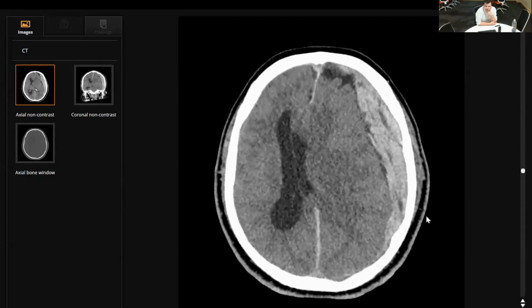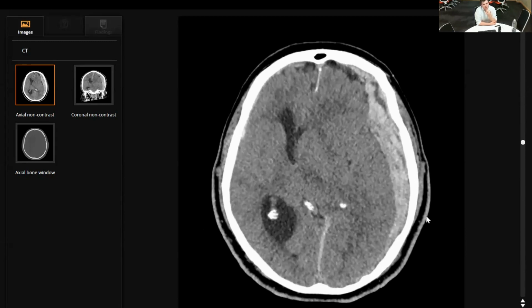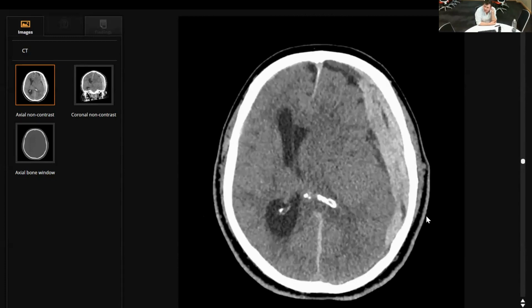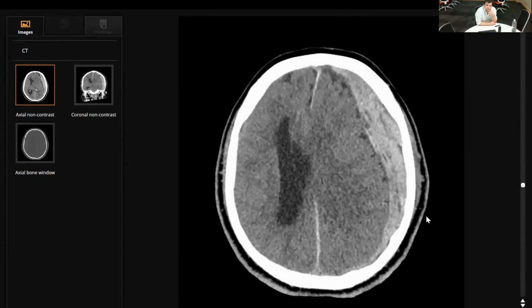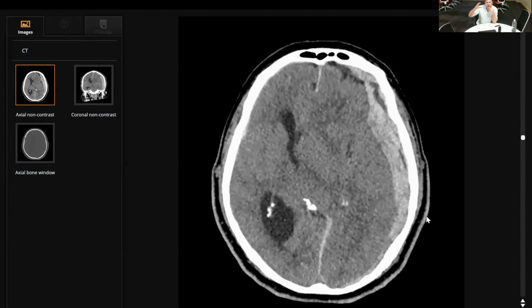Good. So what do you think this bleed up top is? So given the extension of the bleed, I think it's subdural. Yeah, and you can follow the shape of it as well. It's just caused a lot of mass effect. So why is it that different density? Why is it heterogeneous? So it could be the different age of the blood products within the collection. Yeah. So you remember the acute and chronic that we showed before? It's kind of got that bit more of a layering kind of established thing, and then the acute bleed.